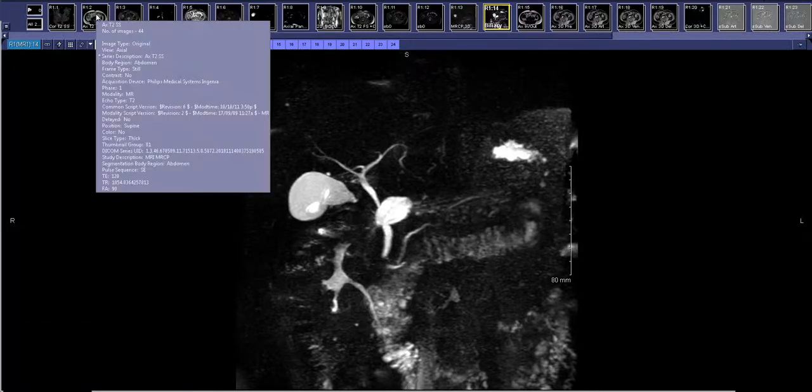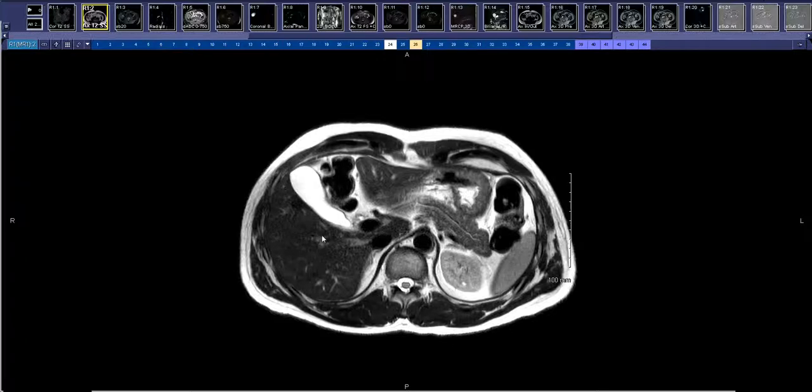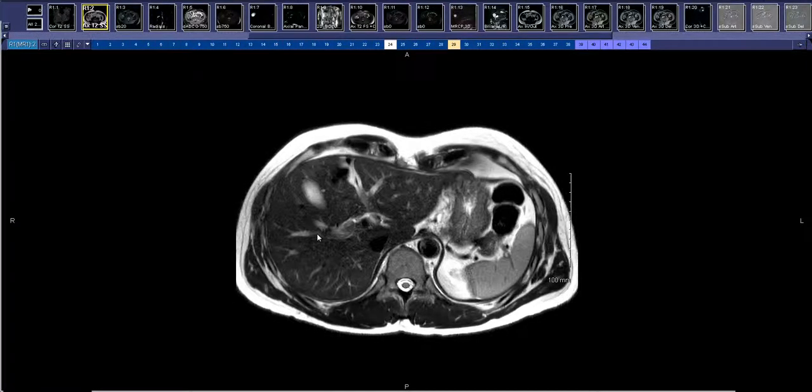Additionally, basically an entire liver MRI is obtained with T1, T2, and post-contrast images. So if there are focal lesions in the liver, like a hemangioma or a cyst, you can most definitively characterize them. There are some liver lesions, like adenomas, which may preclude someone from donating part of their liver, depending on what they are. Obviously, if they were worrisome for malignancy, and depending on the adenoma, how big or aggressive it appeared, that could alter surgical planning and or preclude someone from donating their liver.